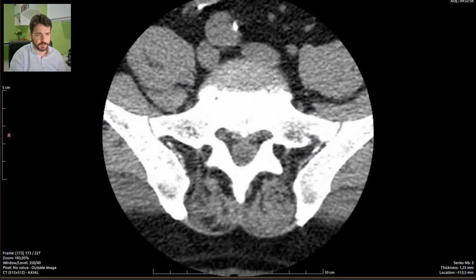The paper the doctor sent to the clinic asking for the exam to be done says it should be contrast enhanced, which makes no sense. We don't do contrast enhancement on CT scans of the spine because they make no sense to be enhanced.